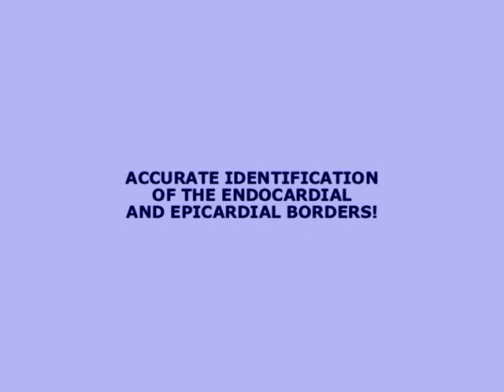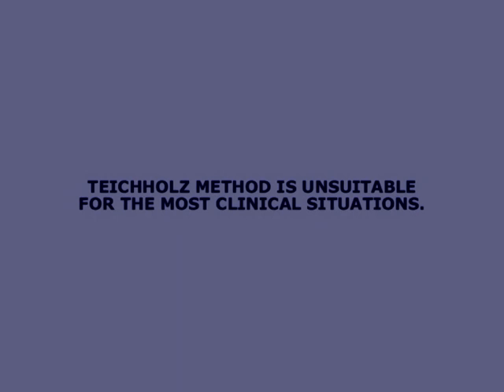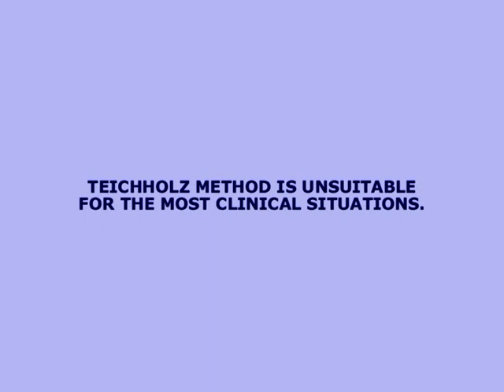Another challenge is to accurately identify the endocardial and epicardial borders and avoid confusion with the contiguous structures, for example chordae, trabeculations, near the posterior wall, and false tendons. In most clinical situations, one cannot use the Teicholz method to calculate left ventricular ejection fraction.